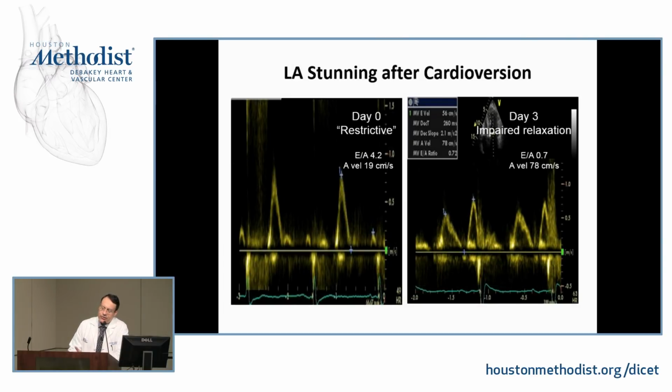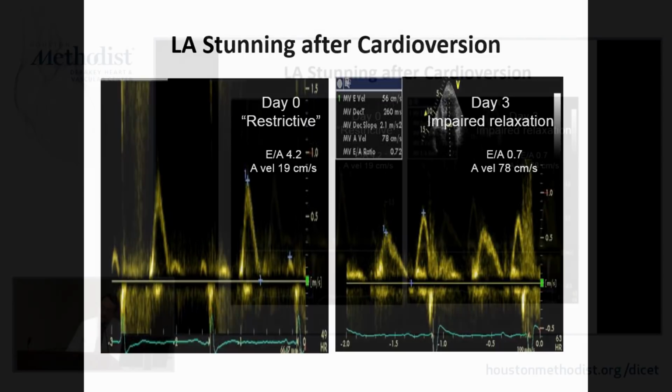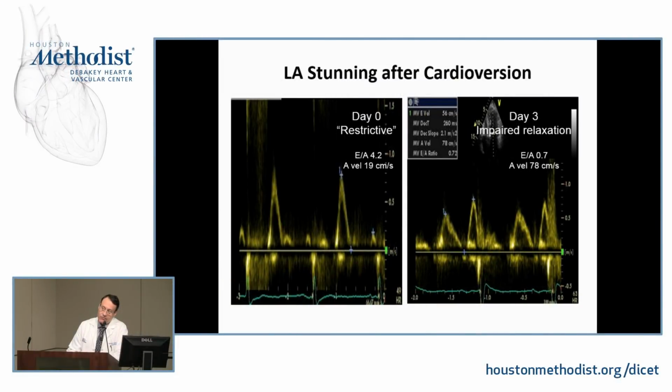An example where a clinical history can mess things up is shown on this slide. So ignore the title here and let us just look at the mitral inflow. Very high E, minuscule A, restrictive filling. Okay? Well, the reason this looks the way it does is the patient has just had electric cardioversion. There is atrial stunning. Atrial contractility goes down. Mitral A is very small. So this is not true restrictive. This is what you can refer to as pseudo-restrictive, and one should not use it to draw inferences now.